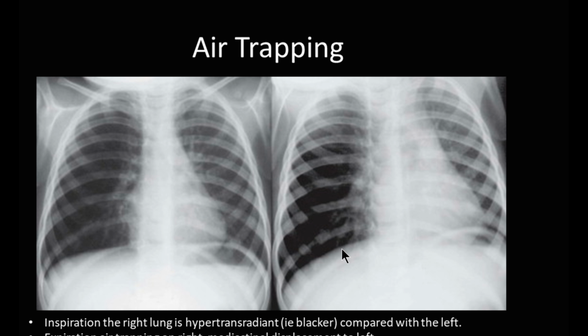One of the tricky parts is when people aspirate food, you won't see it on X-ray. It won't be dense enough to see compared to the lungs and the bony structures above it. In this case, the child had aspirated a peanut into the right bronchus, and it's not visible on this radiograph. Each time the patient would take a deep breath, air would work around the peanut. However, it couldn't work its way back out.